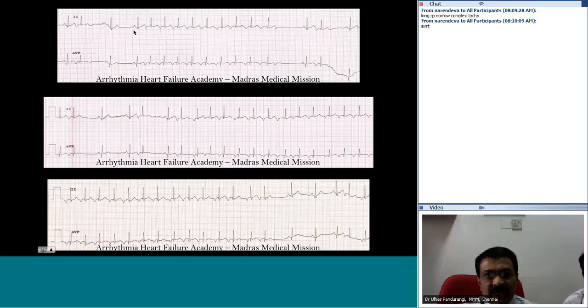So consistently a tachyarrhythmia starting in such a way, connected to the previous normal looking QRS, and if it is persistent and the tachycardia terminates with another abnormal looking P wave, that means there is a P wave on top of that. So a tachycardia which terminates with a P wave cannot be atrial tachycardia. Similarly, a tachycardia which starts with a P wave superimposing on the T, consistently associated with a normal looking QRS, means this is an orthodromic tachycardia using an accessory pathway, and the VA conduction, that is the retrograde conduction across the pathway, is delayed. So a PJRT is an orthodromic tachycardia that uses an accessory pathway only in the retrograde direction, and this accessory pathway is characterized by slow conduction.